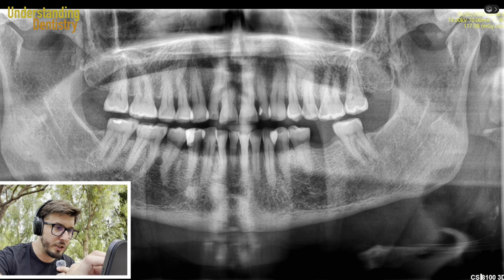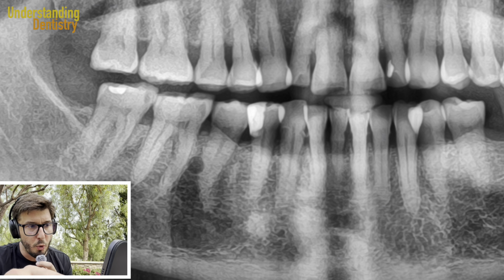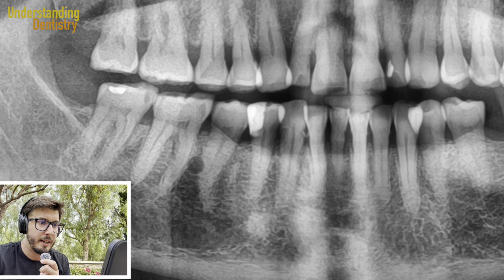So where is the lesion? So of course, this is the lesion, okay, between the first lower molar and second premolar, and we have the lesion there in the middle third of this root. We are also seeing a hypodense or radiolucent image suggestive of caries. So we have interproximal caries as well, even mesial caries of the molar, but since OPG doesn't give you details, most likely you would prefer to order a periapical radiograph to see more details, and that's perfectly fine, right?